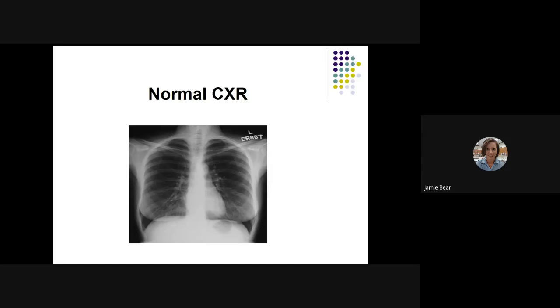Okay, here's another one. And we know this is a female. Let's just all get it out there and giggle. Okay, here's breast tissue. So here, this is a really good picture.